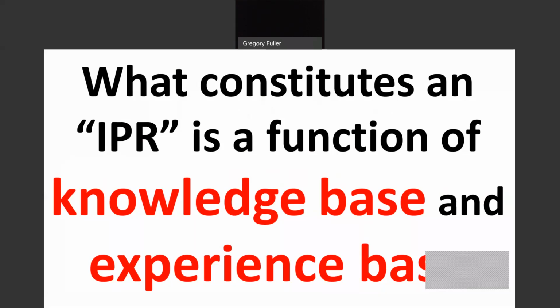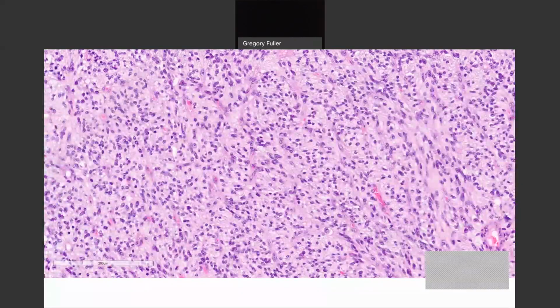All right, ready? Okay, now I'm not just going to give you one field like the last one. I'm going to show you about four fields, H&E fields of this process and this lesion. We'll call it a lesion. I want you to take each one in. So have a look at this. What you're doing, you're gestalting the whole thing. That's number one, gestalt the overall, the big view. Then you're going to get down granular, look at the cells, look at the nuclei, shape, size, etc.